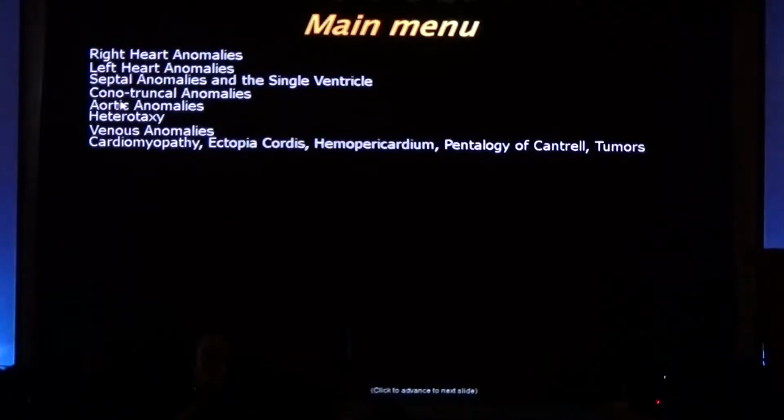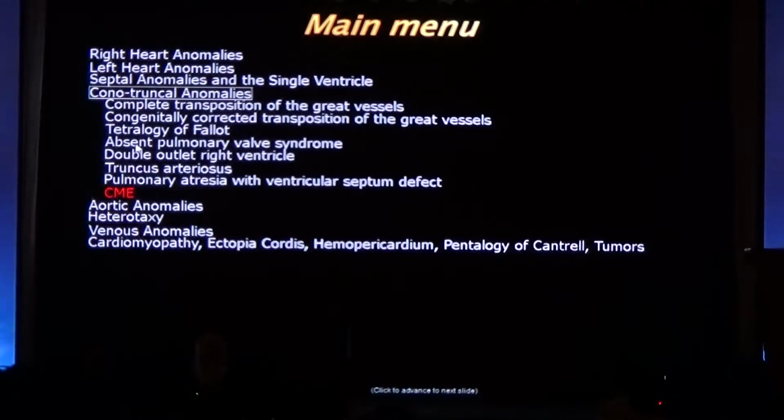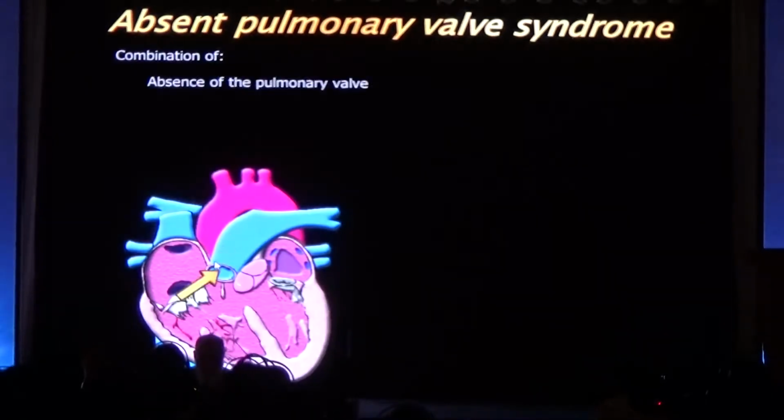So let me show you the extreme form of tetralogy of Fallot, which is the absent pulmonary valve syndrome. So here what we have is the same findings.